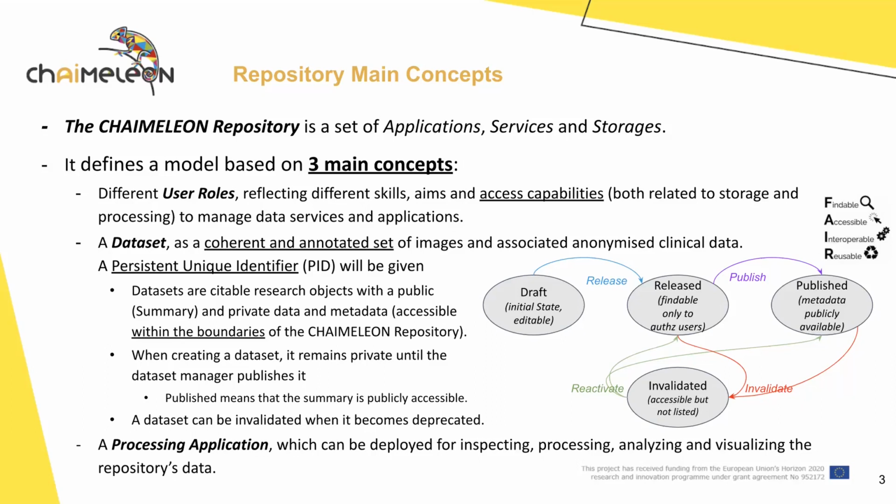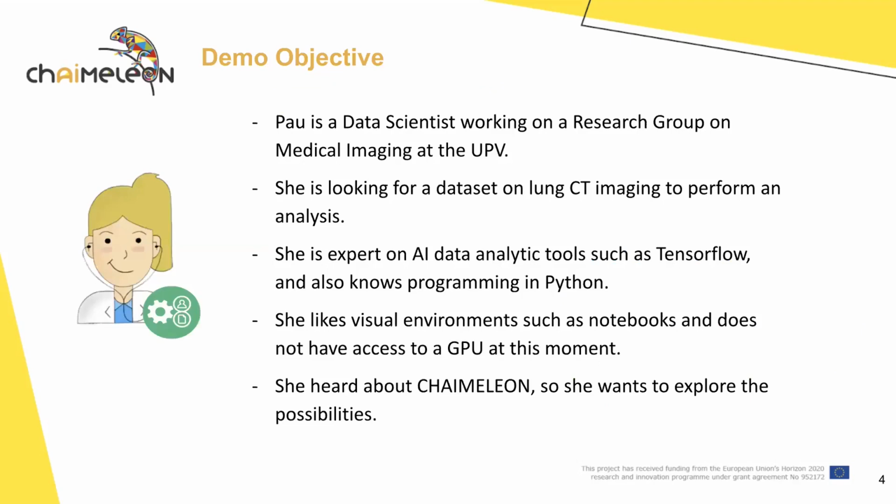This data is processed and accessed in situ in the CHAIMELEON platform by means of processing applications that can be deployed for inspecting, processing, analyzing, and visualizing the repository's data. So this is the outline of the demonstration.